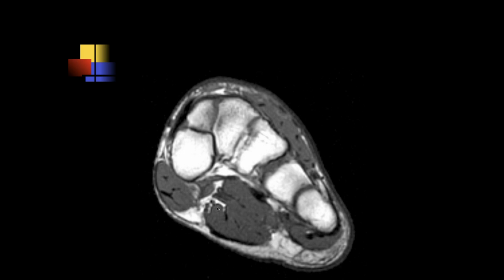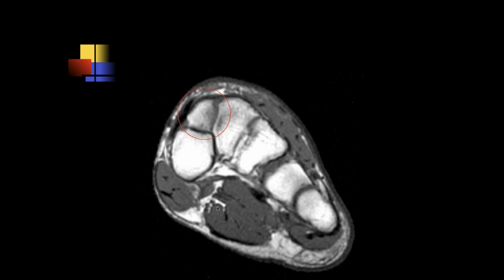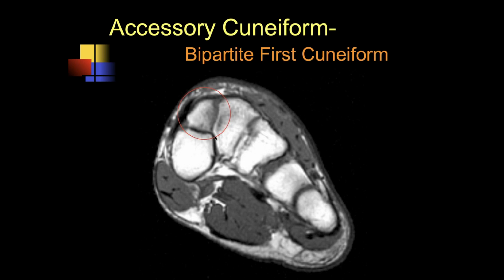Okay, let's see. Ashu, what do you think is going on here? It's a little hard to see. Let me show a couple of images. Well, what do you think that might be? Oh, sorry about that. I'll say anyway.